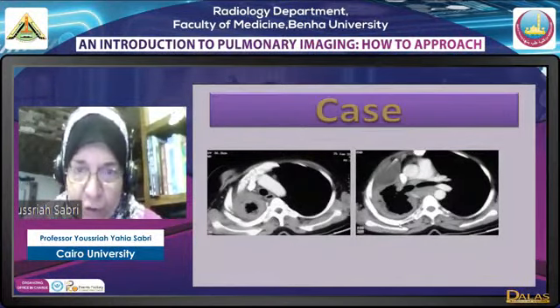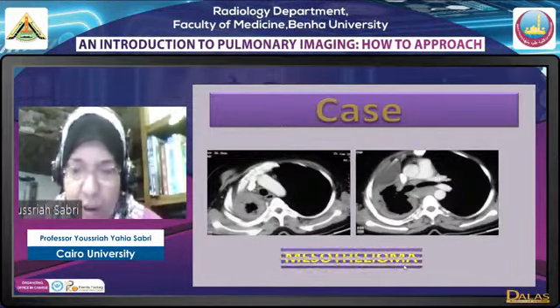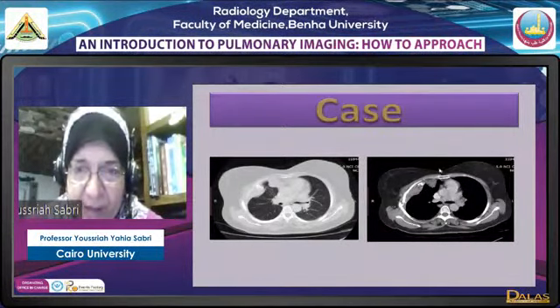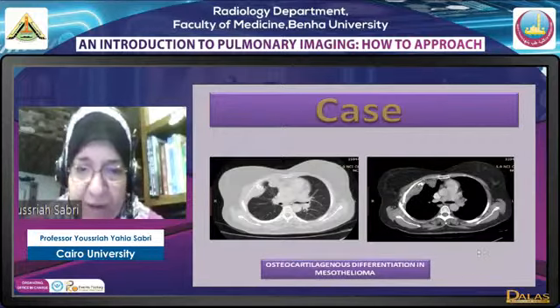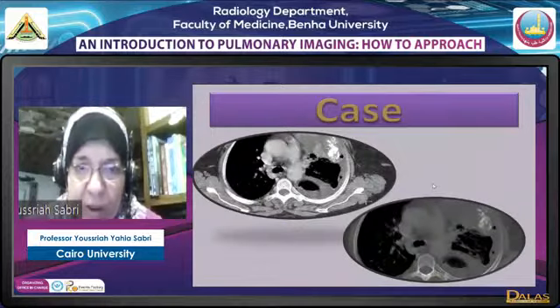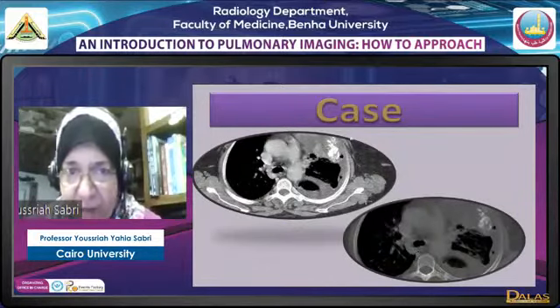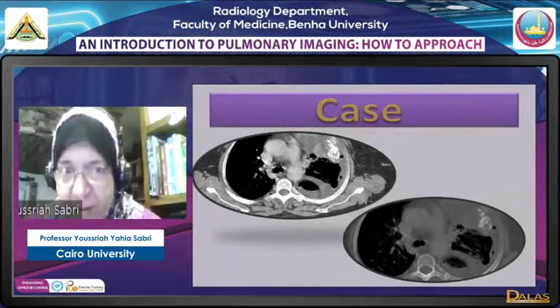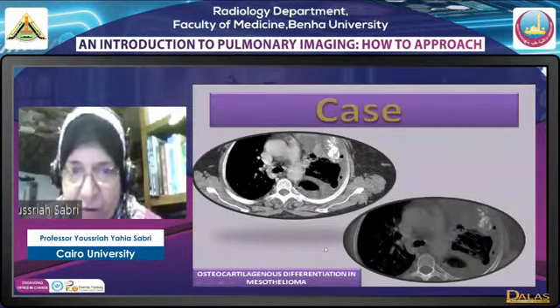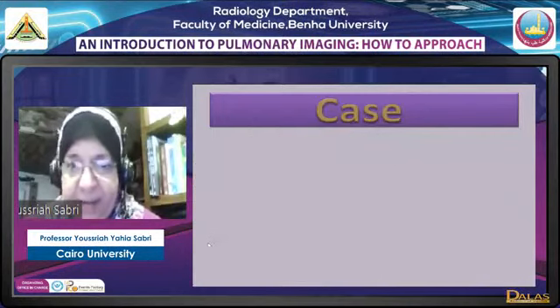If it is decreased volume, it is more pathognomonic. Circumferential nodular thickening associated with effusion. Now, mesothelioma may be associated with strange patterns of calcification, globular calcification, and this is osteocartilaginous differentiation in mesothelioma. This is a focal area of mesothelioma, and this is globular calcification. This is another case of mesothelioma with fissural affection, and again the calcification has nothing to do with asbestos. This globular calcification is a lesion by itself in the mesothelioma, called osteocartilaginous differentiation, and it could be very massive, as in this case.